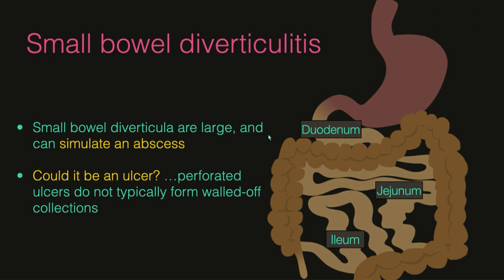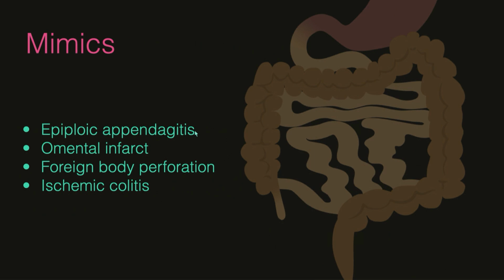You might even be tempted to say differential includes ulcer versus diverticulitis, but I'm going to show you why that is not necessary. And actually, well, I guess your differential could be abscess, ulcer, or diverticulitis, but let me try to convince you why you should lean into diverticulitis. And keeping in mind for ulcers, that perforated ulcers do not typically form a walled-off collection like we're going to see for diverticula. We had all those cases earlier where we saw free air, and then for that non-perforated one, it was relatively small. So you'll see these are a different flavor.